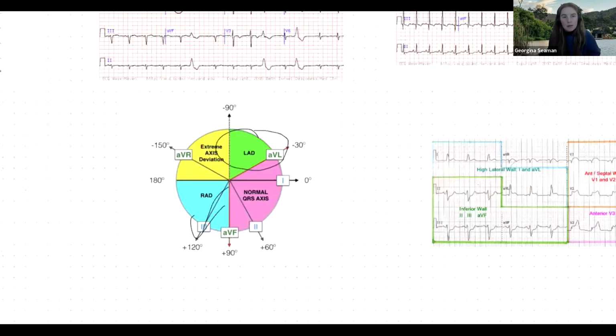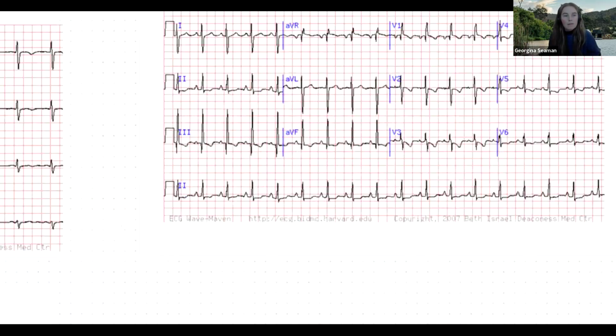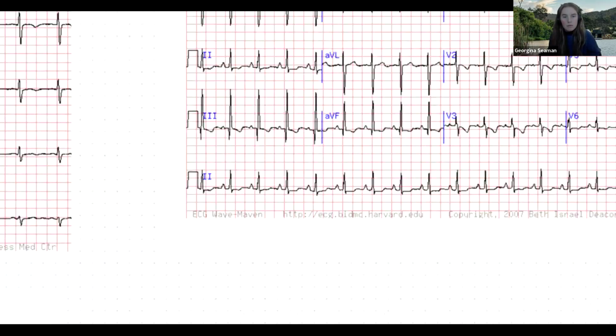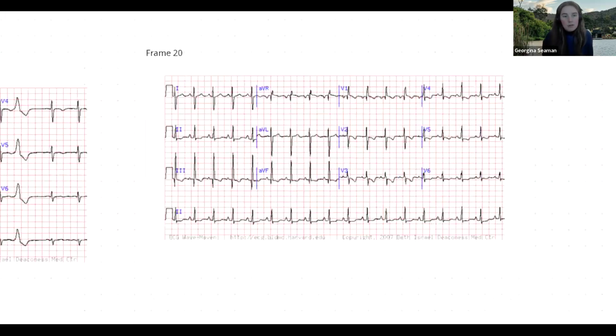All right, where were we? Sorry, are we on this one? Yeah. What else do we know? AVR is positive when it should be negative. Absolutely. But is it completely positive, or is it half-half? For sure, yeah. And our P wave is also negative.